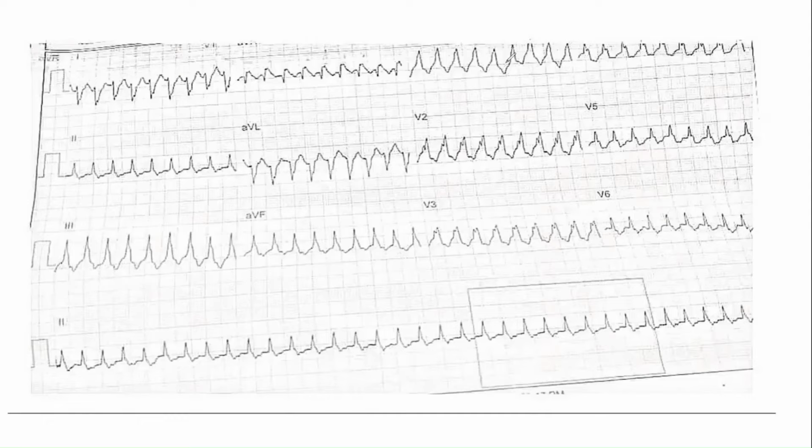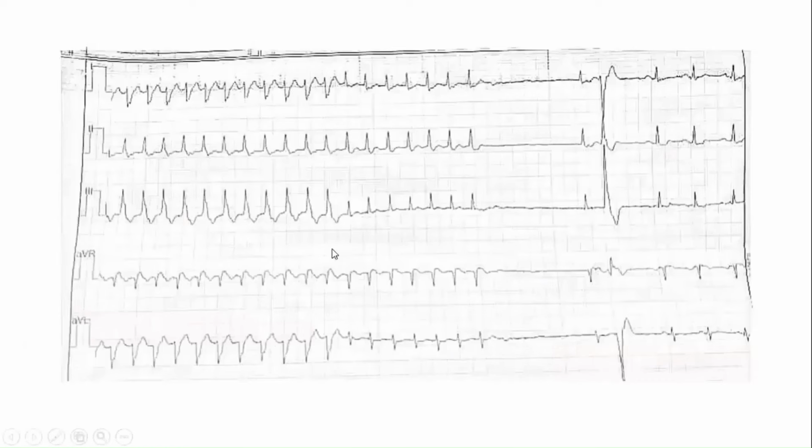So antidromic again is unlikely. Now look what happened. Suddenly this patient went from this to this. This is the same tachycardia, and now look, it went from broad to narrow. So which is out? VT is out, antidromic is out, right? It is impossible that the QRS is narrow with antidromic, because it will always be broad. And VT will also be out. So this patient was a case of SVT with aberrancy. Somehow his aberrancy vanished, and we can see an SVT running along. Here it terminated spontaneously, and then there was a bit of a pause, and then the sinus took over.